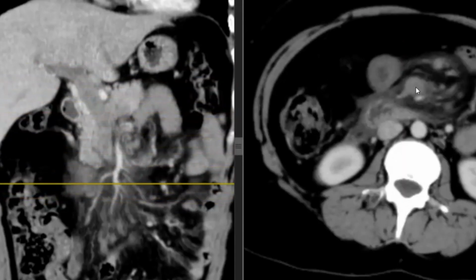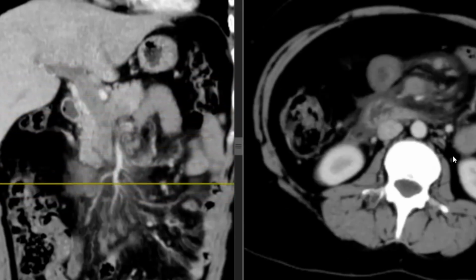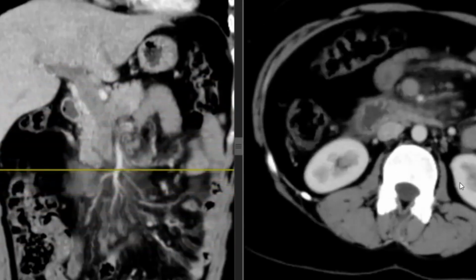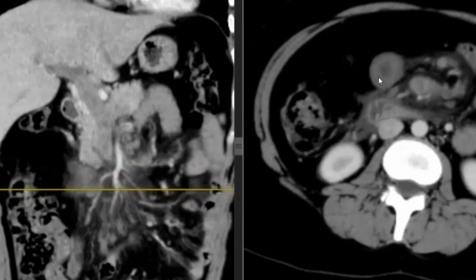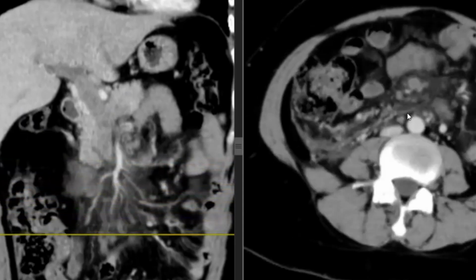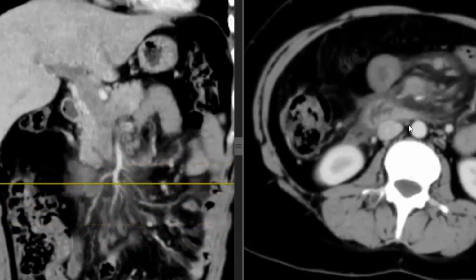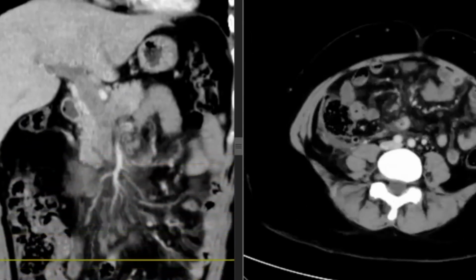It's not only hypodense, but widened, enlarged, because it's filled with thrombus. So this is a case of portal vein thrombosis extending to the superior mesenteric vein and the splenic vein. Amazing. And to confirm that, you can see the bowel loops. See how edematous it is? Yes, this bowel is edematous, and there is fat stranding, and the mesenteric fat is not clear surrounding this bowel loop. Totally agree. You are perfectly correct, and it's a very nice approach to the case.